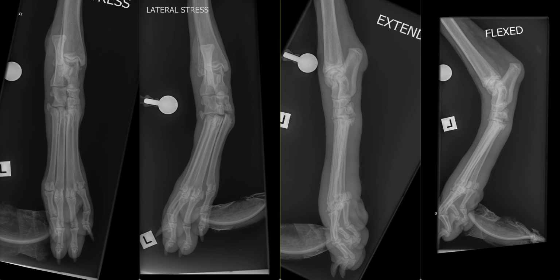Computed tomography may provide a more complete characterization of the fragments, while high resolution and highly skilled ultrasound can also provide more insight to the soft tissue structures, specifically some of the parts of the medial collateral ligament. Be sure to view the full report associated with this case.